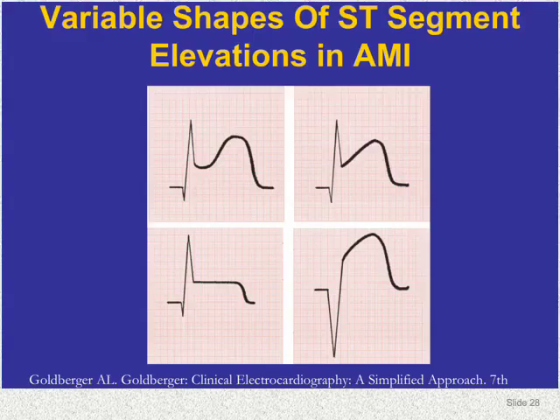The shape of this ST segment elevation is actually different, but all share this J point. This is the junction of QRS and ST segment. As you see here, it should be isoelectric, but here it is elevated almost 1, 2, and 3 small squares, and it can be flat. Usually it is convex, as you see here, but it has different shapes. All this signifies ST elevation MI, and all share that we have pathological Q together with this ST segment elevation.